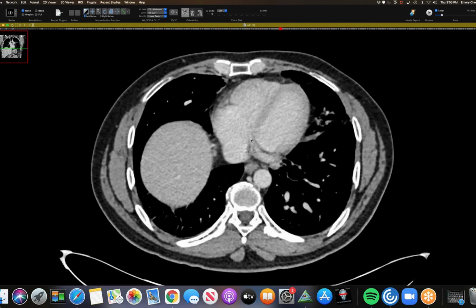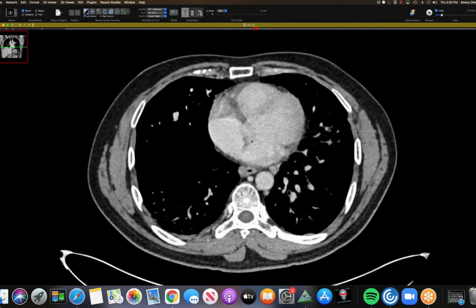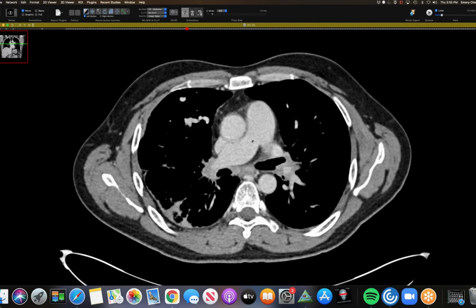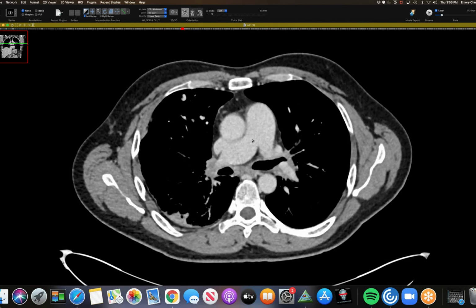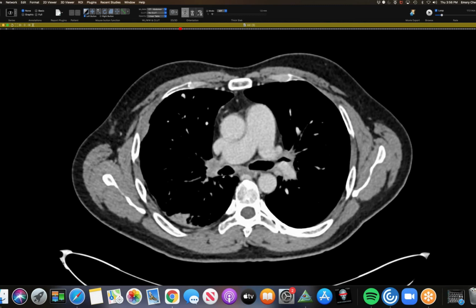Oh, there's a lot of tissue about vessels and bronchi in the hilar, infrahilar, mediastinal region, all over. Yeah, it looks awful. I think somebody should sample some of those nodes. Oof, yeah, I think that's worthwhile. Those would be easy to get with EBUS.